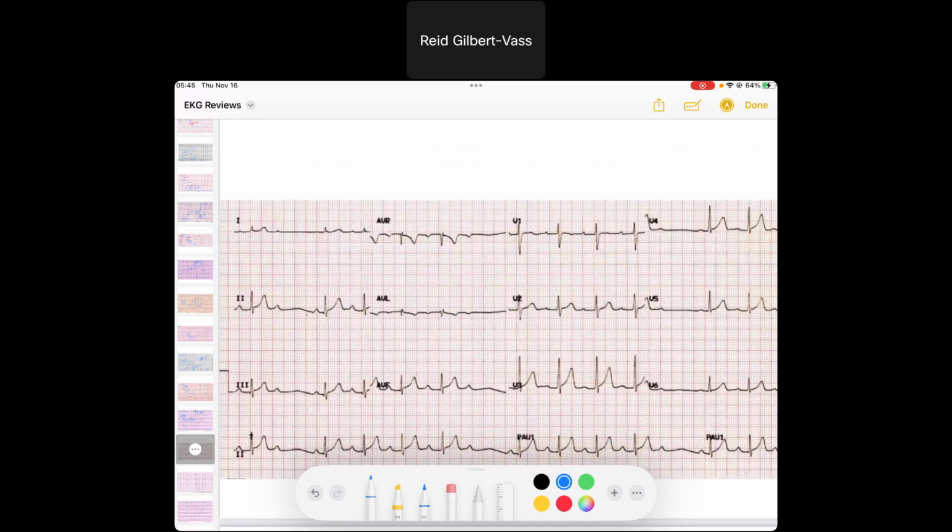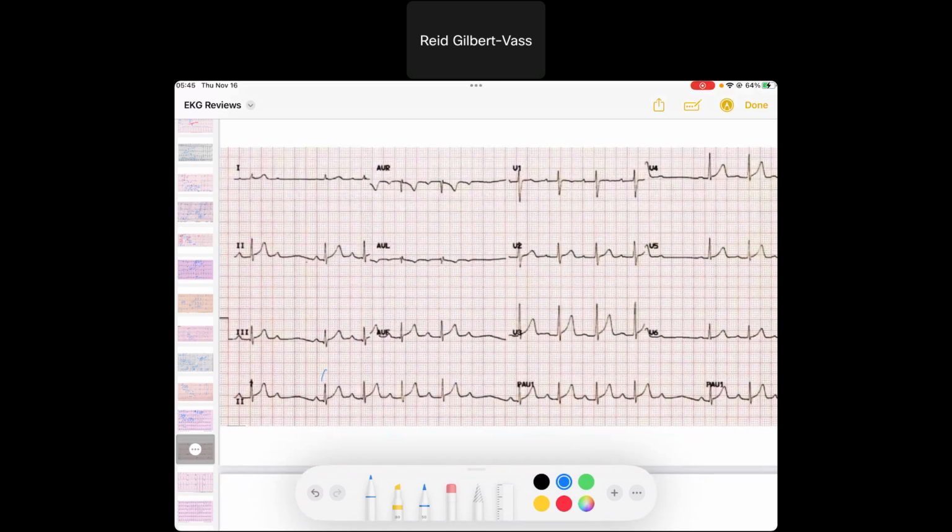Okay. So we've got an EKG here. We've got regular beats until there's a gap. Regular beats until there's a gap. And so what's the first thing that comes to my mind when I see groups beating regularly with narrow QRSs? I think maybe there's an AV block. And so let's take a look.